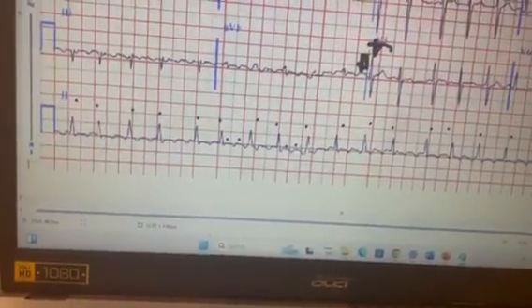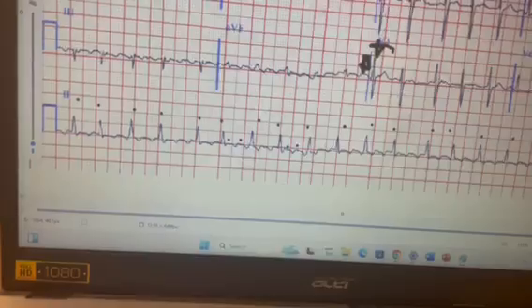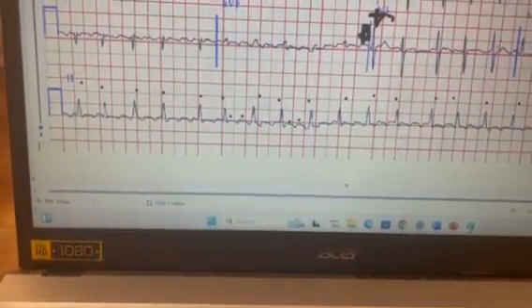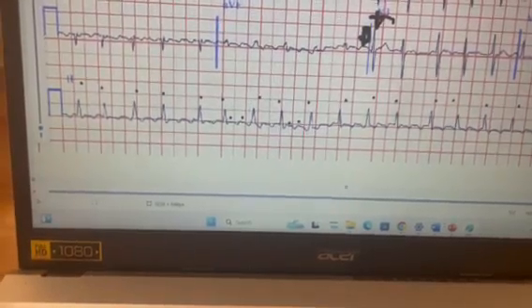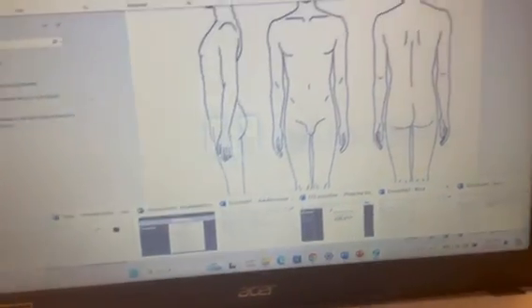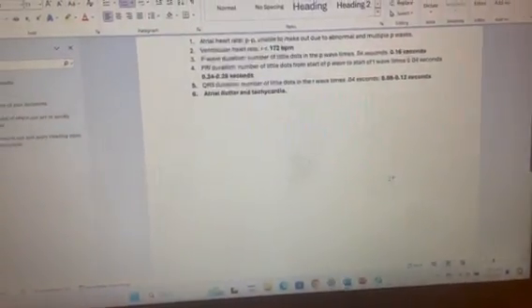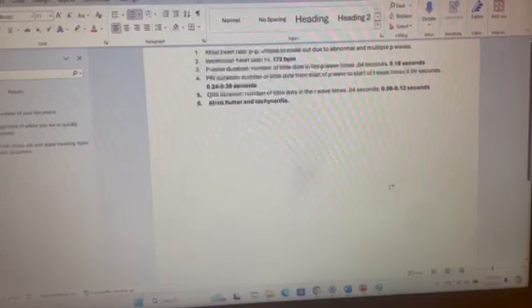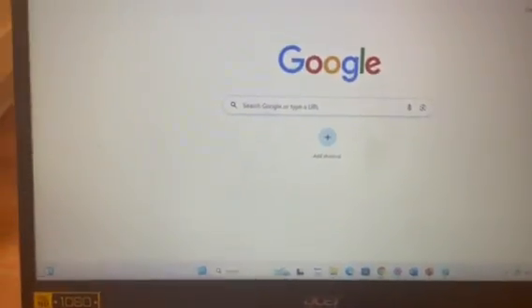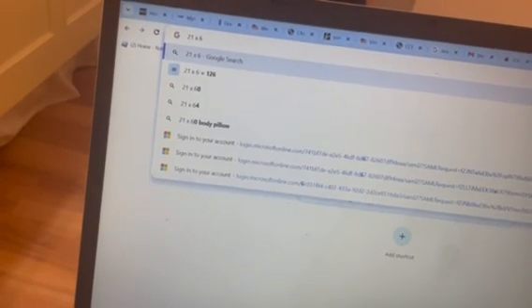As I said before, we're going to multiply by 6. 21 times 6, hold on, let me do a quick little multiplication. 126, yep.